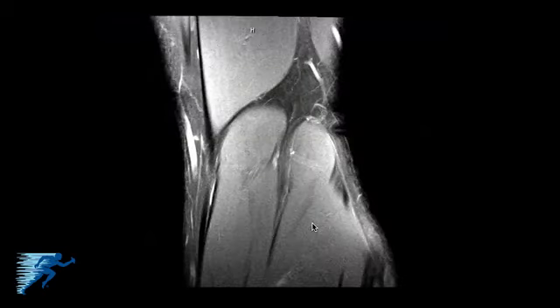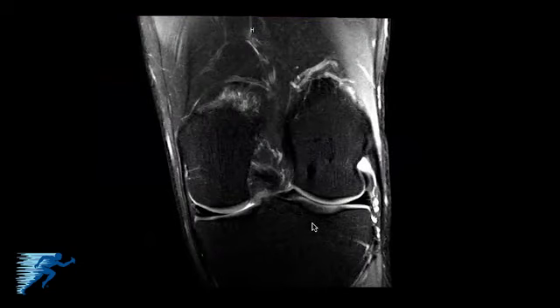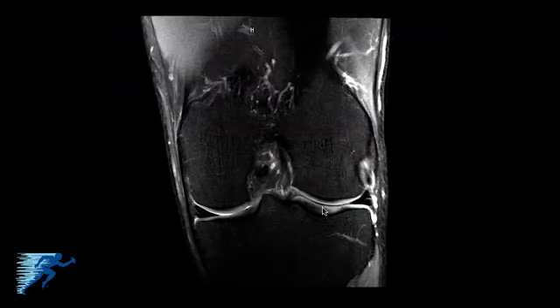Here's the popliteus muscle along here, and you can see as we course forward the popliteus tendon at the musculotendinous junction, and then coursing more anterior. As we get more to the back of the knee, we'll start to see more of the gastrocnemius muscles. And that's basically the main structures that we'll look for in the coronal MRIs. Clinically, most of the time we're looking for meniscal tears either in the medial meniscus or the lateral meniscus here.